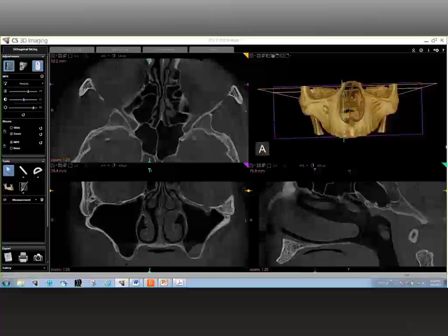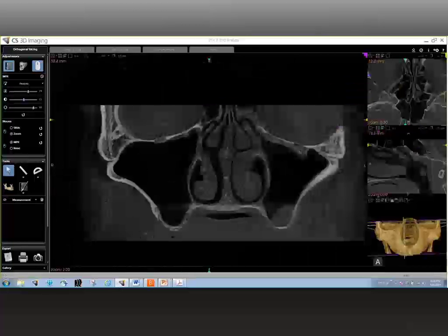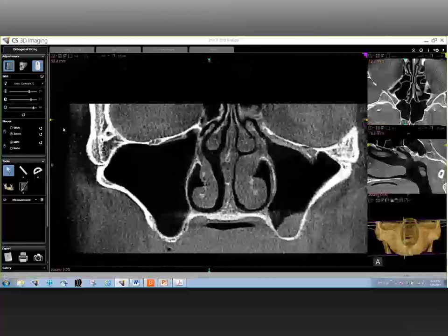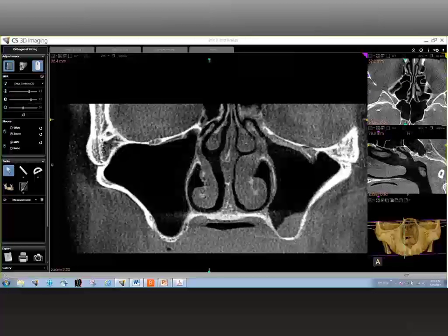What are the important anatomical landmarks of the maxillary sinus? One of the easiest ways to look at it, there are not a whole lot of landmarks to evaluate, but the ones that are there are very important. Firstly, when you look into the sinus, you see the floor of the sinus. The floor is very simple to identify. It is nothing but the most inferior point of the sinus. And then you have the lateral wall of the sinus right there. And then you have the roof of the sinus, which is the topmost extension, which also borders the infraorbital rim, or the lower border of the orbits.